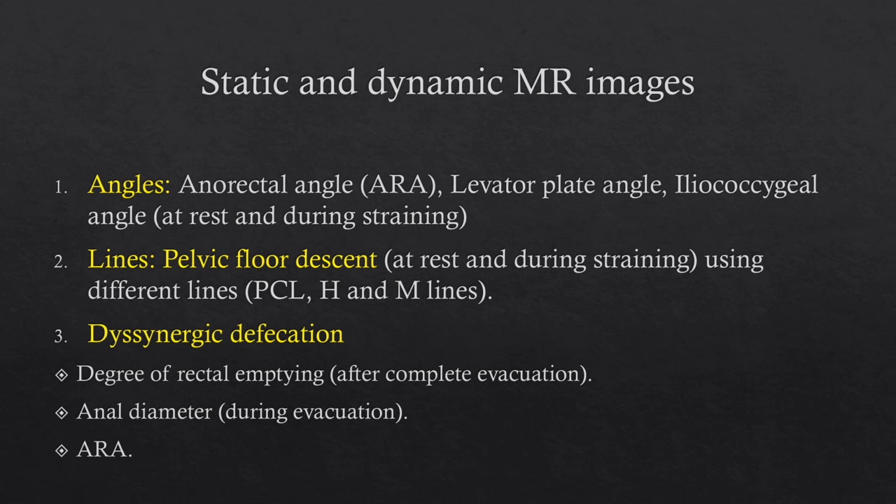Regarding dyssynergic defecation, this is a functional obstruction. We are using some parameters regarding the degree of rectal emptying and also the anal diameter, and again the anorectal angle, to assess any functional obstruction.